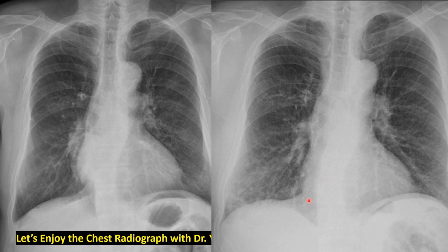What's the difference? We see the aorta line here. We don't see the aorta line here. And increased density, increased extent. So this is the mass. Relatively large mass developed for 1 year.